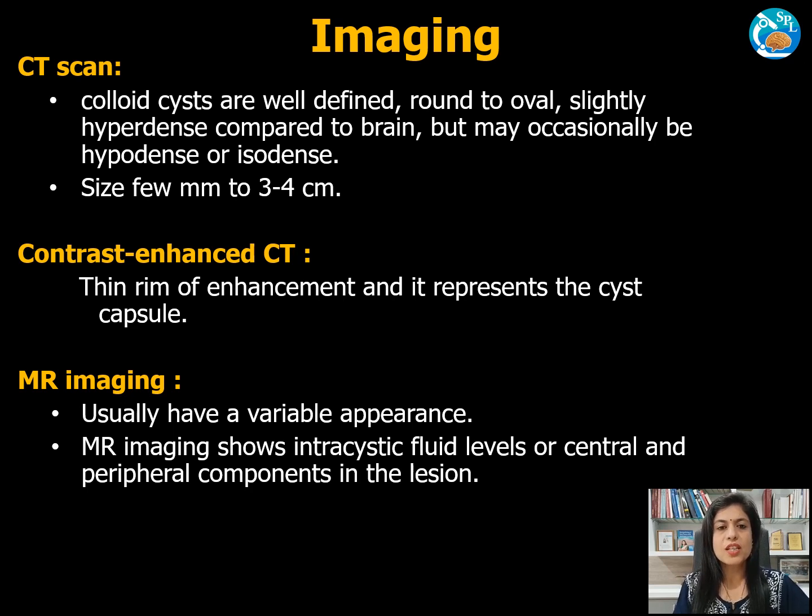MR imaging is considered superior to CT scan and usually has a variable appearance. MR imaging shows intracystic fluid levels or central and peripheral components in the lesion.